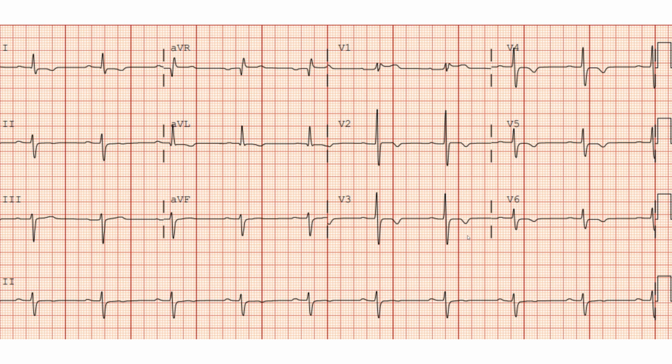That can be a sign of many things. It's mostly consistent with right-sided stress or right ventricular hypertrophy. Other things to consider, remember, anytime you see T-wave inversions in precordial leads, think the 3 Ps: a posterior infarct, a pulmonary strain pattern, or low potassium. This gentleman also has these inversions in the lateral leads. Again, what to make of those depends on what's going on with the patient.